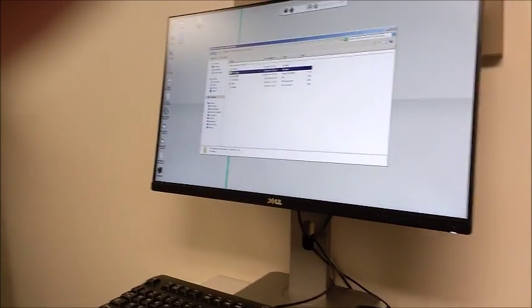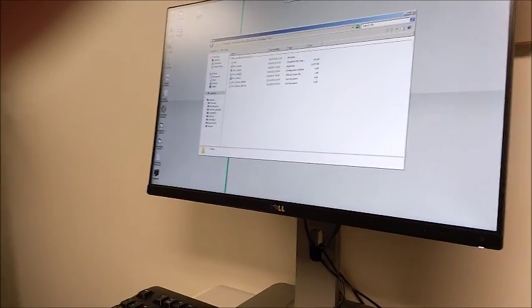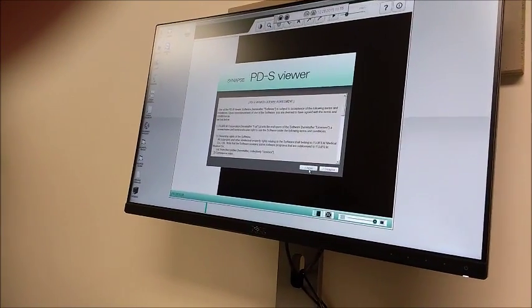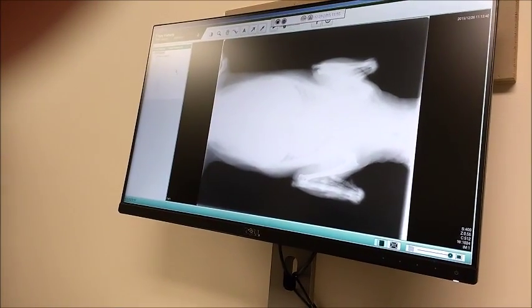Oh, you know what? If they put it in their drive, it would auto open, if the client took it home. Yeah, I didn't have that checked though. That's fair. This is the kind of viewer they'll get.